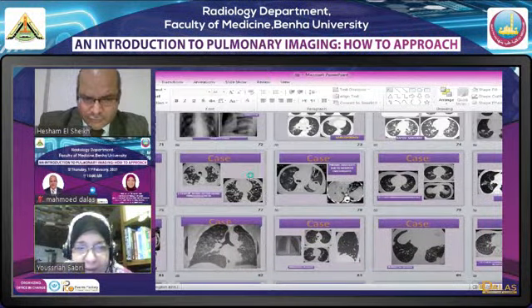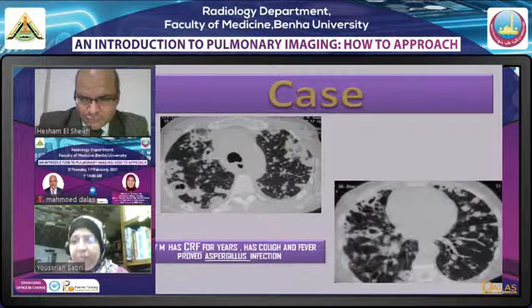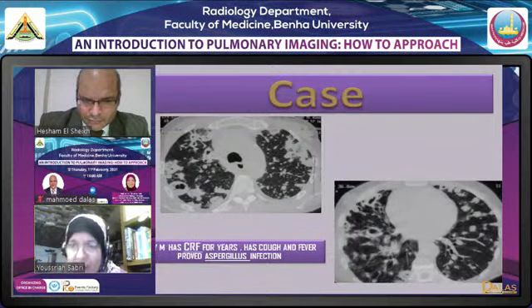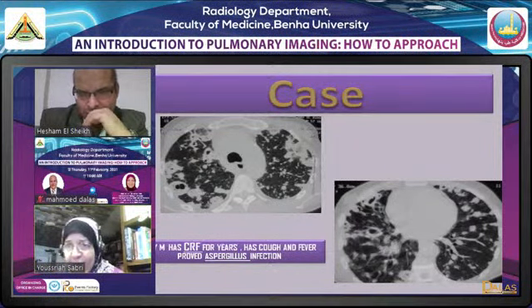نبص على الحالة دي. This was atypical infection. يعني ايه atypical؟ يعني not typical. طب ايه هو التيبيكال؟ هو ايه اللي انا بشوفه في الانفكشن؟ بشوف ممكن لو هي جايه باي بلاد بورن بشوف نودولز وكافيتيتنج نودولز. لو هي جايه ثرو ذا اير بشوف الباتشز بتاع البرونكونيمونيا اللي شفناها في كذا حاله وريناها.